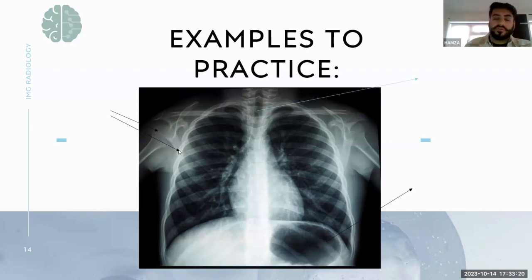The other arrow just beneath it is your rib cage. Again, that's an example of bone. And more medially to it, you've got the right lung. Now, the lung is all black, as Dr. Tiju explained in the previous couple of slides. Why it's black is because lungs are full of air. So we're going to reveal all the answers, although I think you guys got it right anyway. Go ahead and reveal the answers.